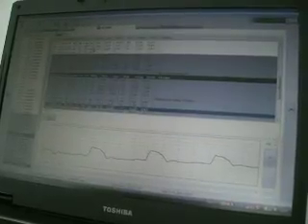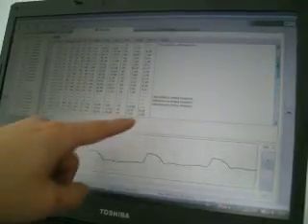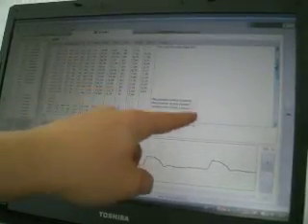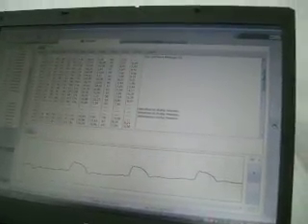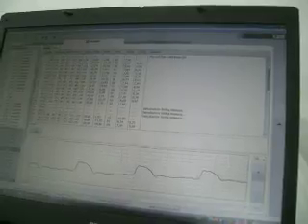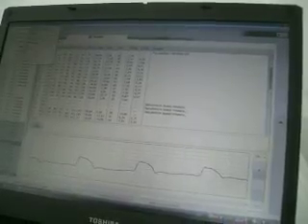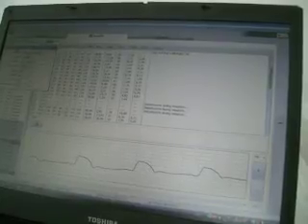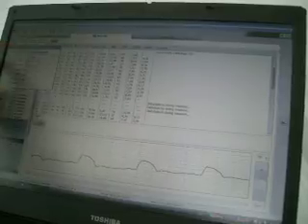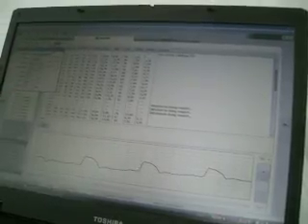Let's go to the data. Here you can see the complete list with some explanation for the errors. There are some different options up here. First of all, patient details. That's just a quick reminder. That's one window that stays always on the top and gives you a reminder of the patient details. You can turn it off.